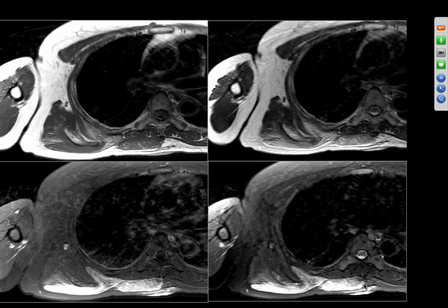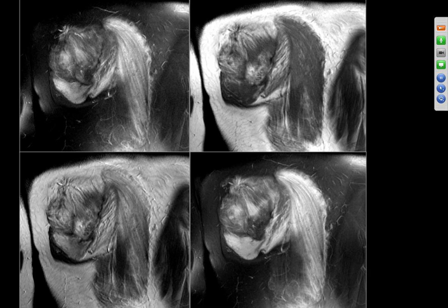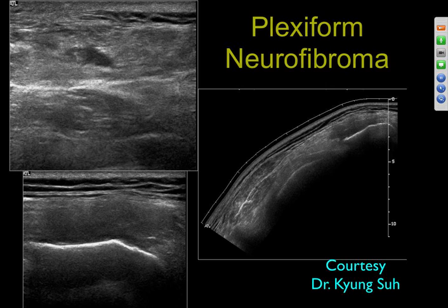I'm pretty worried about maybe a sarcoma, myosarcoma. I think we're in the neurotumor section. I have no clue. A plexiform neurofibroma, maybe? There you go. Yeah, that kind of infiltrated type appearance growing along there. Good.